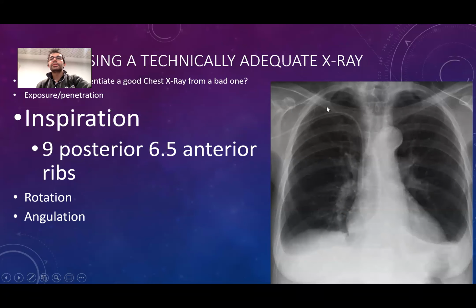But when there is some pathology, the numbers can be different. When I'm counting the ribs from here, 1, 2, 3, 4, 5, it actually ends at 5. So this is not an adequate inspiration. Also, when pathologies are obstructing the view, you can count fewer ribs even in a good inspiration state. Are you detecting something on this patient? I have pointed out there is blunting on both sides, the costophrenic sinuses are not sharp but blunted. Also, there is quite an amount of effusion on the left side, right?